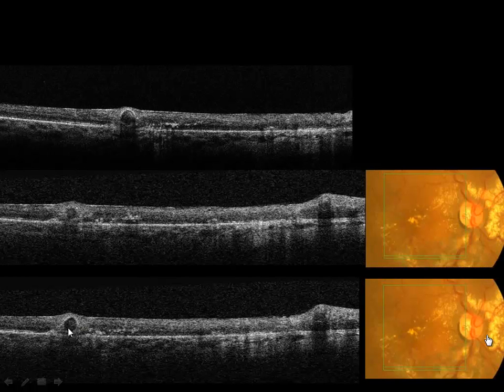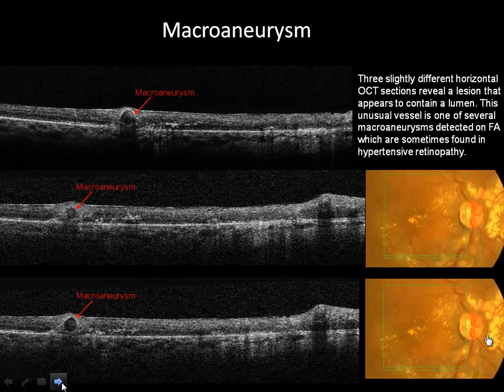And we're getting this, which is very interesting. This is what I'm trying to bring to your attention. It's sort of a round or an oval body. Here it looks fairly round because I have a 1-to-1 magnification here. So it's really something strange. It's a little bit like that tube that we talked about before. But this actually could be a blood vessel. And we'll show you why that could be a blood vessel.